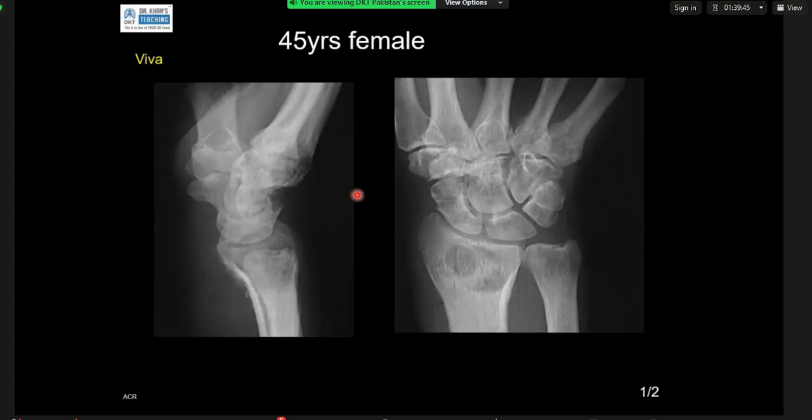No matrix mineralization, no soft tissue component. So it's an aggressive bony lesion causing possible pathological fracture, and there is reduced joint space of the radiocarpal joints and the radioulnar joint. The rest of the carpal bones are normal, and no similar lesions are noted. There is an interrupted periosteal reaction which is well appreciated on the lateral projection.